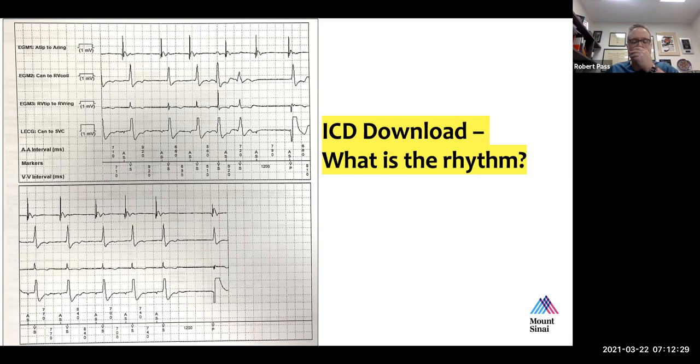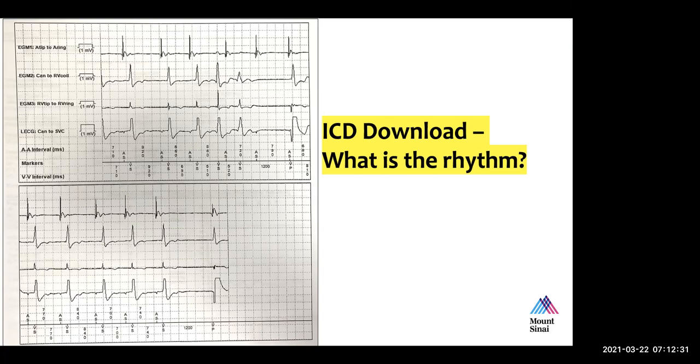It should be, so here it's sensing when it's 1, 2, 3, 1200. So 1200, 60,000 divided by 1200.